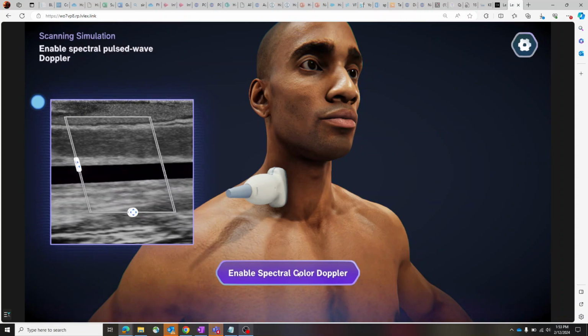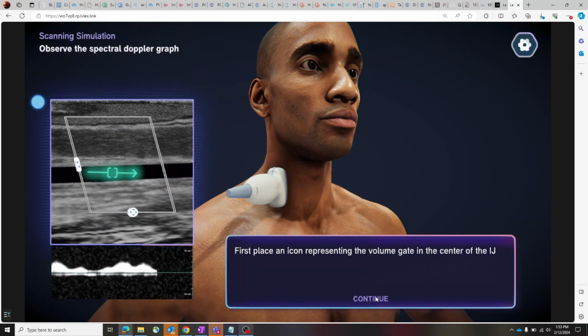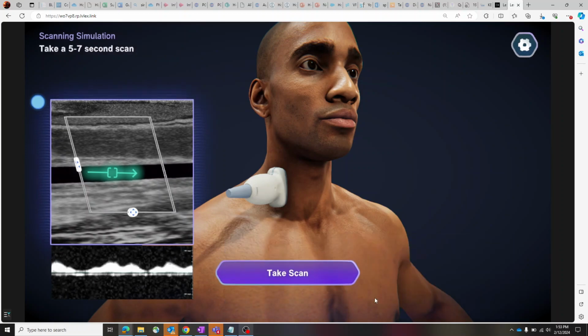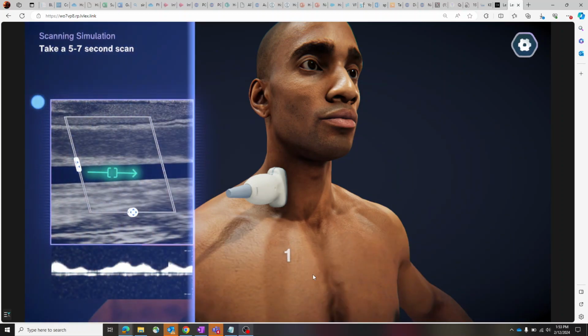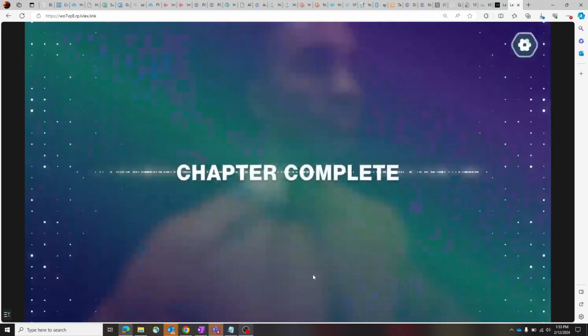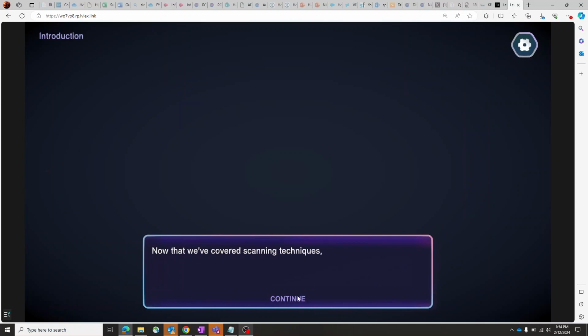And so what we did was we developed and iterated on and improved on our past ultrasound simulator that you saw in some of the previous projects that we discussed. What we did for this iteration was the simulator can be thought of as two components. There's the three-dimensional anatomy, which is essentially a volumetric data set of an anatomical image. And then there's the physical model, which is simulating the propagation of ultrasound waves.